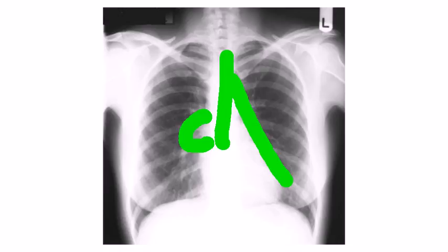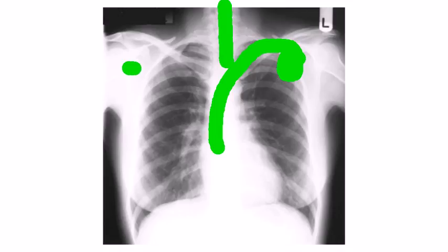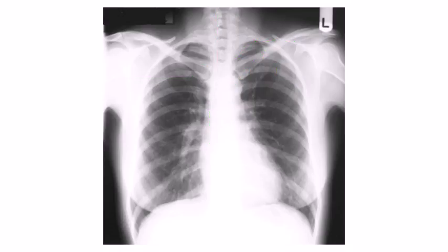The next thing you want to look for is any signs of instrumentation, cannulations, devices, and so on, whether it's a pacemaker device, an ET tube, a central line, or a subclavian IV line. Also look for signs of previous history of CABG in these patients, along with valves or heart valve replacements.